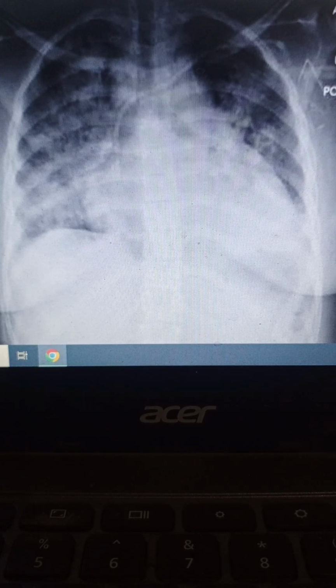So this is an X-ray of a 24-year-old male. This male was admitted to the hospital 2 days back, and at that time his chest X-ray was normal. Now after 2 days, he developed dyspnea and chest pain, and when we did his labs, his HB was decreased and his reticulocyte count was increased. So now can you spot the abnormality or guess the diagnosis by looking at his chest X-ray compared to his initial X-ray at the time of admission, when it was normal?